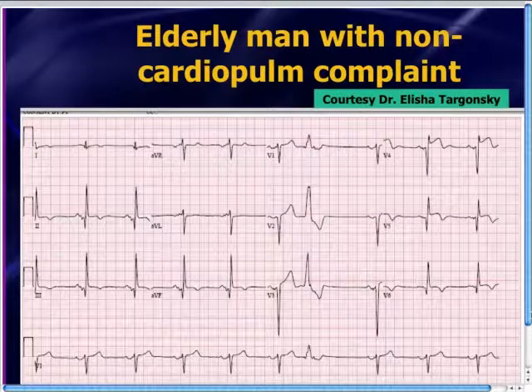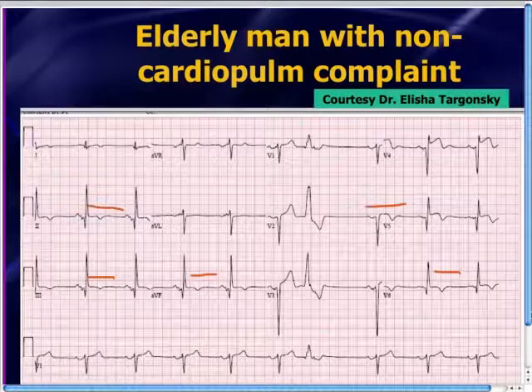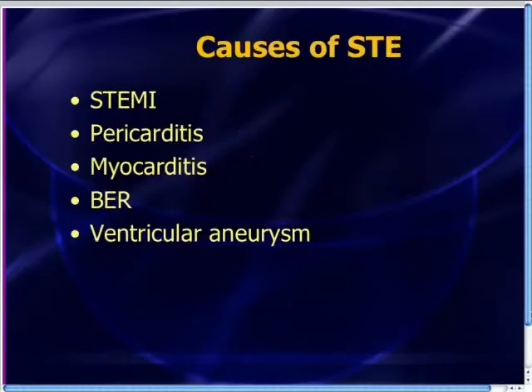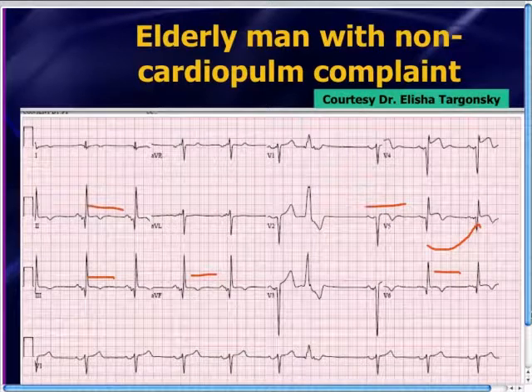And what I would suggest to you is that there's some horizontal ST segments right up there, and probably there as well, and there. This is not the typical concave upwards ST segment elevation that we probably should see with pericarditis and early repol. And also you should not typically see gigantic Q waves with pericarditis and early repol, so let's get rid of those. And myocarditis also should not generally give you gigantic Q waves. And so based on some of those ST segment morphologic abnormalities and the Q waves, we're going to get rid of a few of those things.